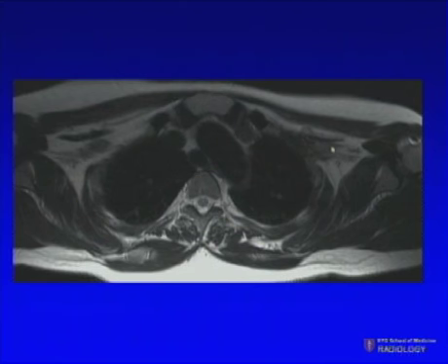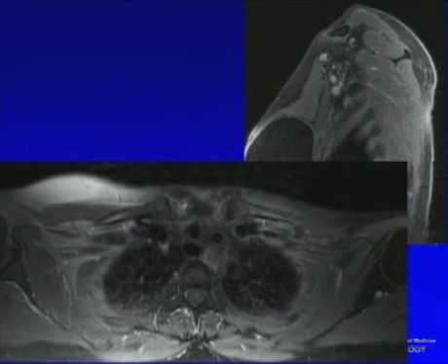On axial images, it's somewhat iso-intense, doesn't really stand out in terms of hyperintense signal. These are the post-contrast images. So here's the subclavian artery, subclavian vein, and you can see the components of the brachial plexus. Not really enhancing, similar intensity to muscle. So when I looked at this case, I'm like, okay, this is radiation fibrosis, nice diffuse thickening, no enhancement, not hyperintense on signal, and that's the way I had dictated out the case.